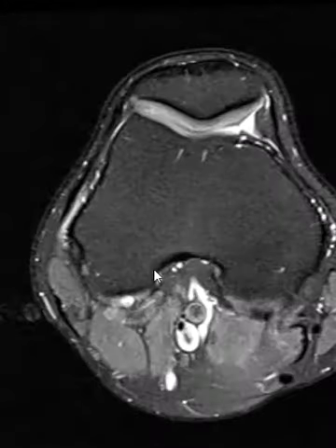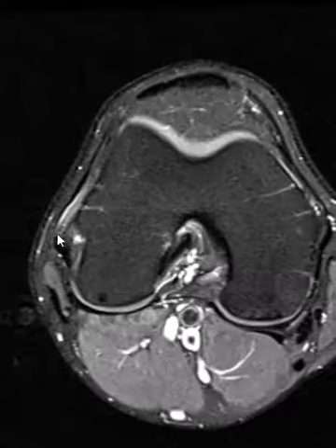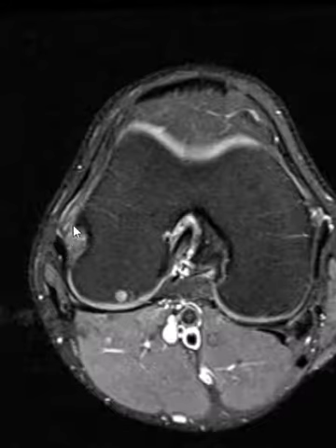Now, if you have any questions, put up the axial images here. Here's where we're looking at on the outside. And right here, this little area that's too bright, too thick. This is that fibular collateral ligament origin, so you can see that this is abnormal. Instead of being clean, it's thickened. And if we go down a couple of cuts, we see this is the fibular collateral ligament. And underneath here is the popliteus tendon origin, and that is not normal either.